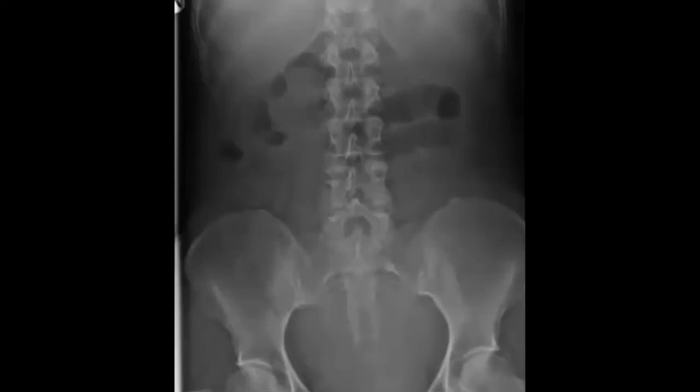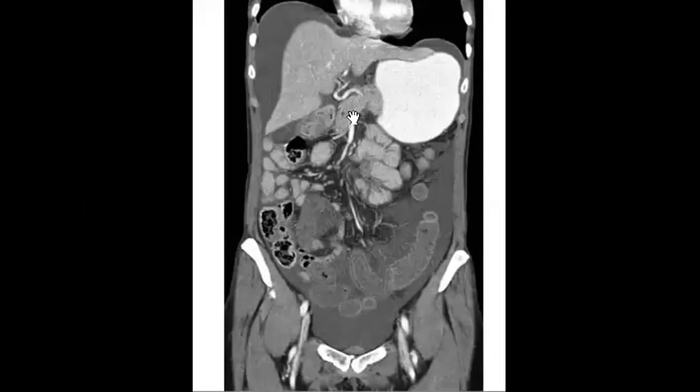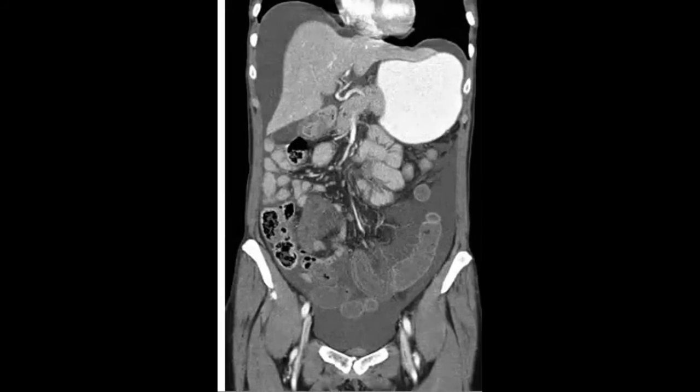So you cannot expect. That's why the most important thing here is that when you suspect it, don't take it easy, okay? And look very carefully for the mesenteric artery and branches. And regarding the exam, they like to show you this because the mortality rate in bowel ischemia is very high if you didn't diagnose it. If you failed to diagnose this, the mortality rate will probably increase with delay. So any delay from you will mean bowel necrosis and mortality.